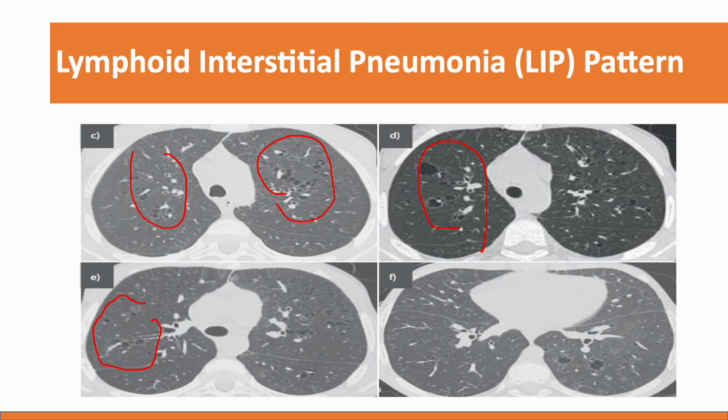But there have been studies which mention that there may actually also be a lot of cases that do not have these cysts. So, since lung biopsy is not frequently performed, this typical presentation is something that one has to be very aware of: the ground glassing and these thin walled cysts.